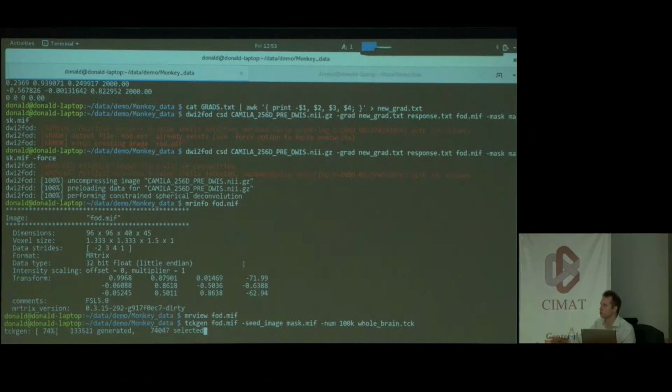The problem is it's not a pure scaling because it will be T1 dependent, and movement will impact a little bit on that, but you can't do very much about that anyway. So what you could try is figure out if there's a little gradient of values that you can repeat every 8 slices to scale them and see if that helps. But other than that, I'm not sure.